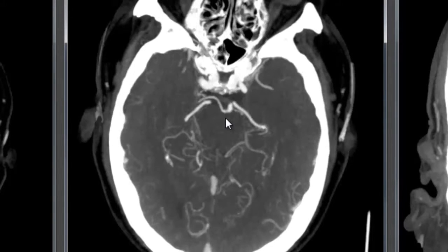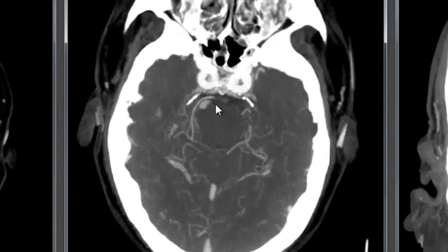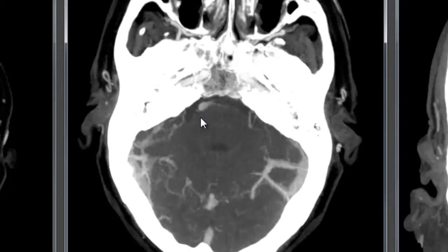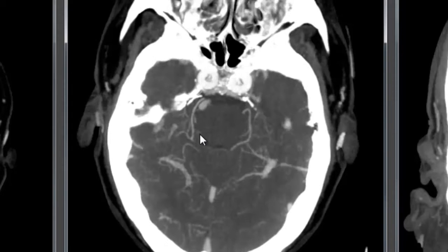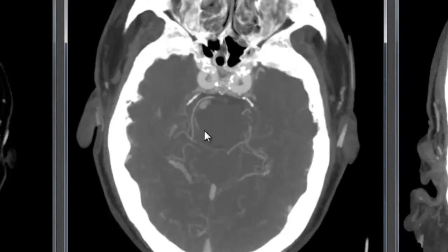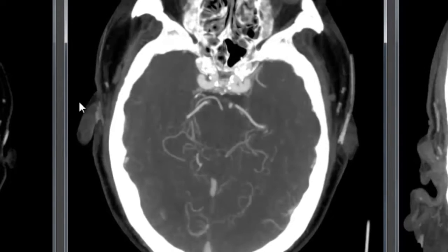And then below this we see no filling for a stretch of the basilar, and then we see some filling here. So essentially, as we talked about in our video on ICA occlusions, we have contrast coming up, but far less opacification of the proximal vessel by the direct injection compared to the anterior circulation in this case, because of that occlusion at the top of the vessel.